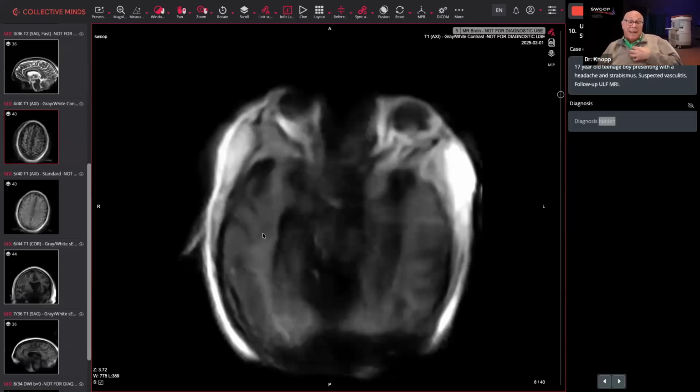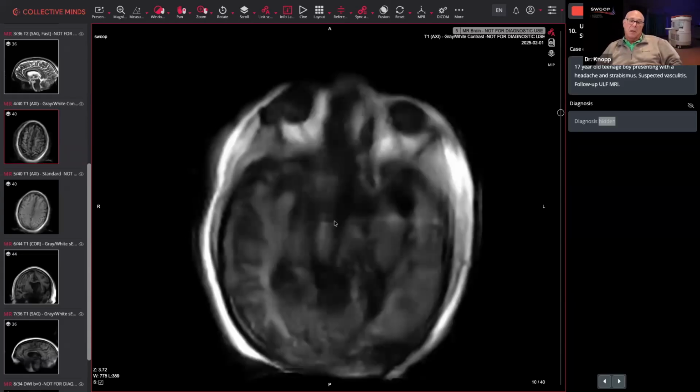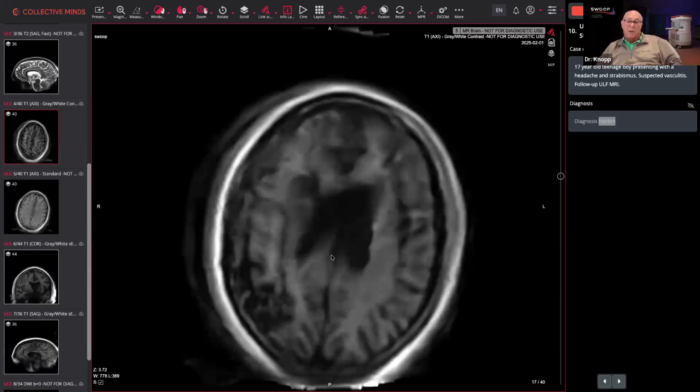From a clinical neuroradiologic standpoint, if we're suspecting vasculitis or maybe meningitis, contrast enhancement and FLAIR imaging are exceedingly helpful, because we can see pathologic enhancement of the leptomeninges, and FLAIR imaging signal change or abnormal signal in the CSF spaces that we're not visualizing.